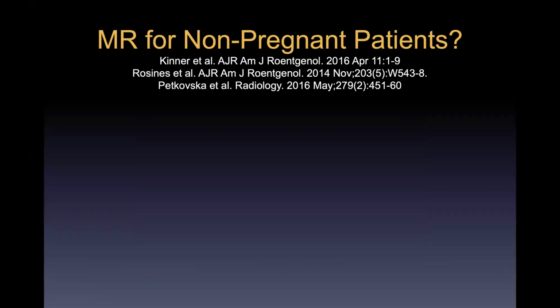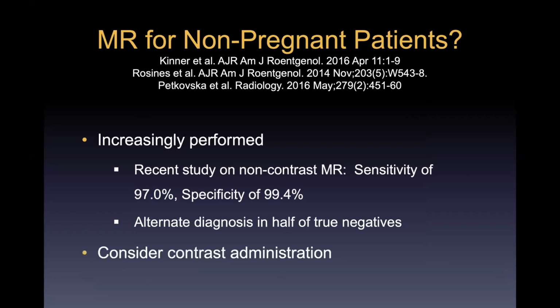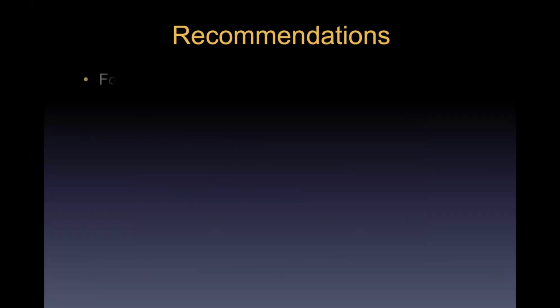So this has been a successful technique, so much so that we're starting to do MR for appendicitis in non-pregnant patients. And obviously, the target group there is kids, particularly older ones who can be still enough for the MR. Good data, even better than in pregnancy. Still able to make alternate diagnoses. And when the patients are not pregnant, you can, of course, give contrast.